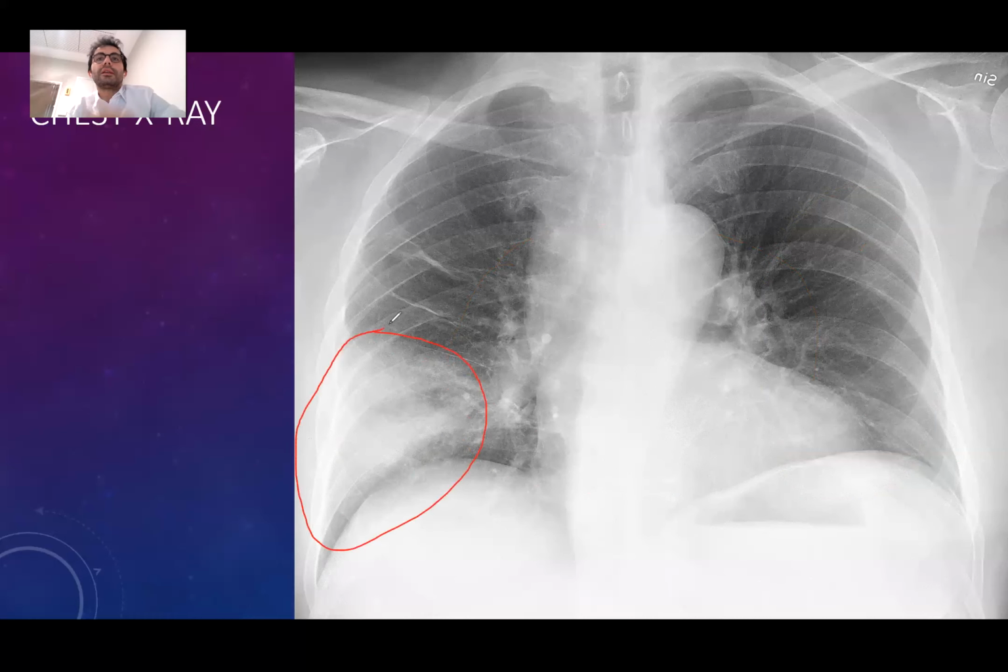It is probably pneumonia. Can this be a case of, for example, pulmonary infarct due to pulmonary emboli, some big pulmonary emboli? Yeah, very well, yes. Maybe. We don't have the clinical information. I don't have the clinical information. Like, what is the CRP of the patient? If the C-reactive protein is high, if the patient has fever, if the patient is coughing, if the patient has increased white blood count, then yeah, it's a pneumonia. If the patient has none of this and has this appearance, then, well, maybe it's a mass. Like, who knows, right? This is just an X-ray. All right, thank you, doctor. Good one.